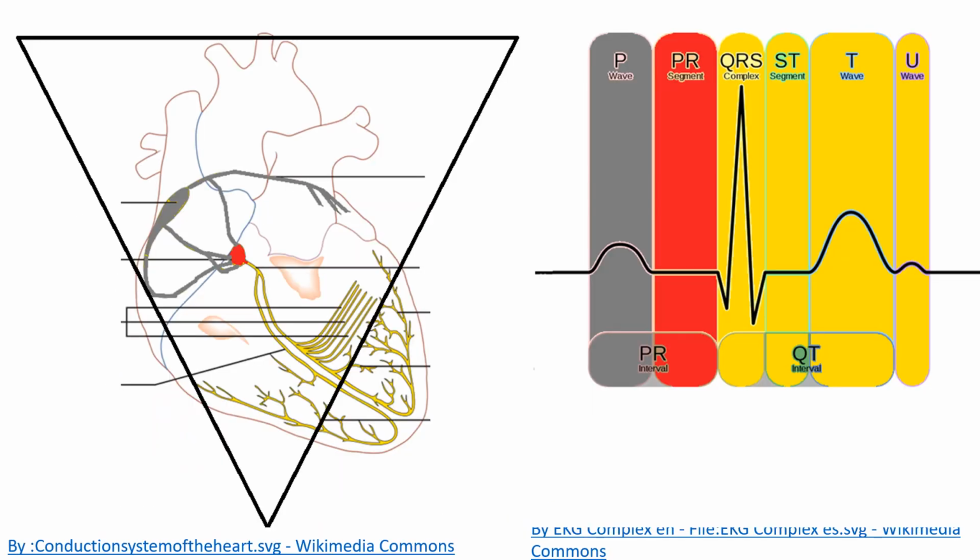All right, so atrial pacing. So kind of a quick recap here. So normal, right? That SA node right here fires. And so the electricity is going to go from here down into the ventricles through these internodal pathways, stuff like that. It's also going to go over here. And so that's going to generate my P wave, right? Now the electricity has to go through this AV node. And so that's going to generate this flat line. And now that goes through this His-Purkinje system. That's when it's going to generate the rest of these waves.